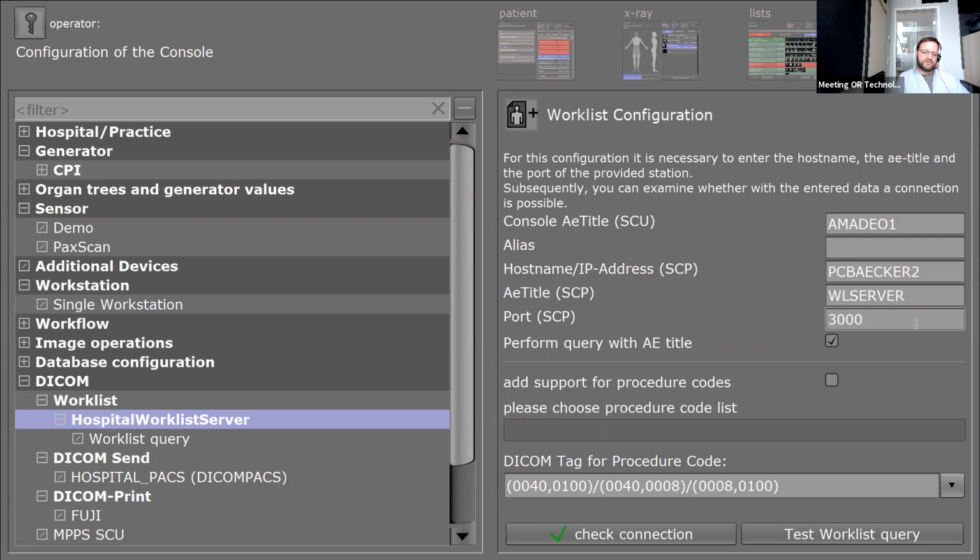And if they want to have us predefined, you can also choose whatever, 105, for example, and say to the IT, okay, we will ask the worklist server on port 105. And the same here. So it doesn't matter if the IT will predefine the settings or you predefine, but normally it will be the hospital's IT. Did I understand the question correctly?